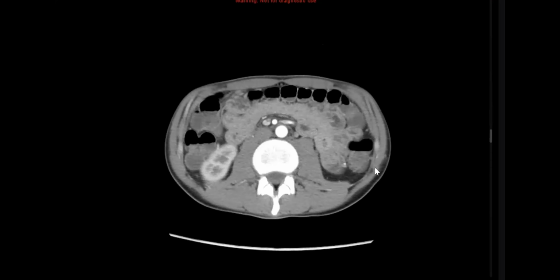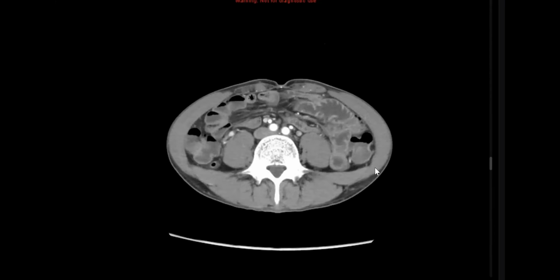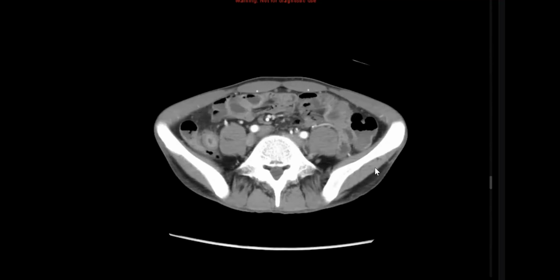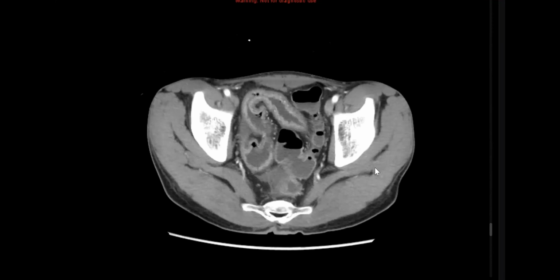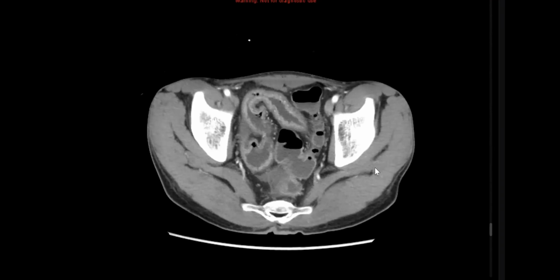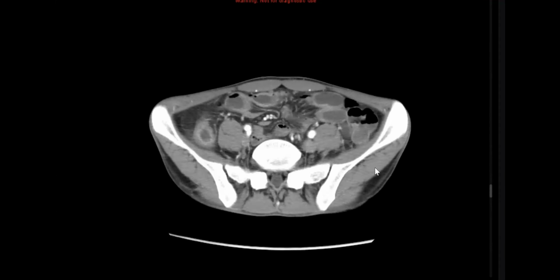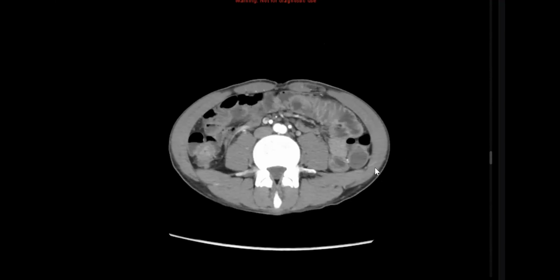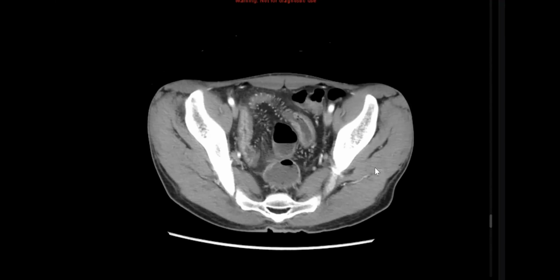Kidneys look fine. Avoid, in the exam, my friends, avoid a long stop. Either you scroll rapidly, or if you see multiple cuts like here, avoid a long stop. I don't see any ring-enhancing or margin-enhancing lesion in the liver. Normal fat planes around the pancreas, normal fat planes around the kidneys. Okay, I am going down to the bowel. Continue talking.